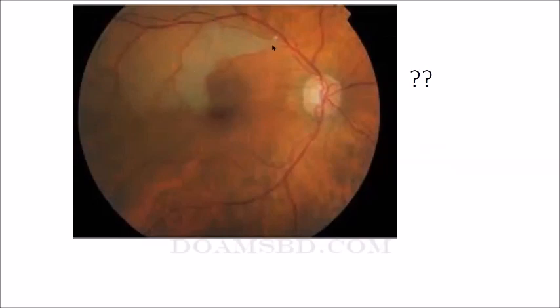What is the appearance? Wedge shape appearance, right? Any artery that is blocked, the distal area will lack blood supply in a wedge-shaped manner. Everywhere it is true. It is true in the brain, it is true in the lungs. So infarction in the lung, infarction in the brain, everywhere the infarcted area will be a wedge shape. This depends on the branching pattern of the blood vessel.